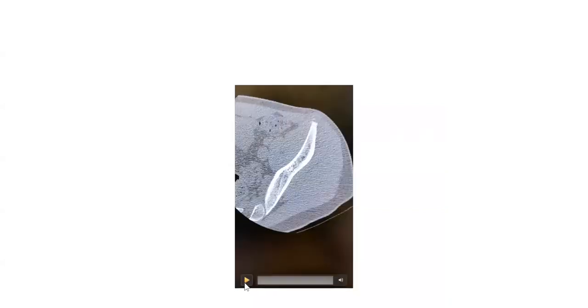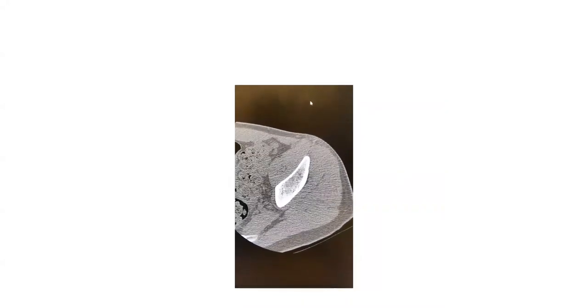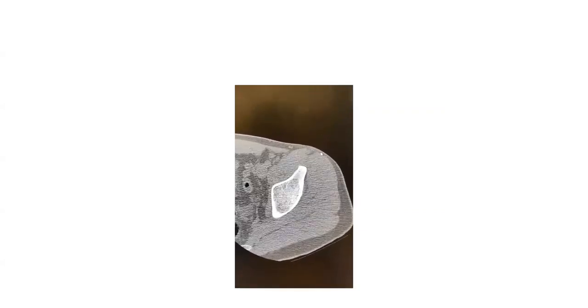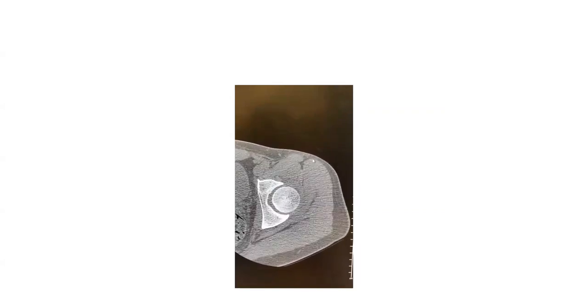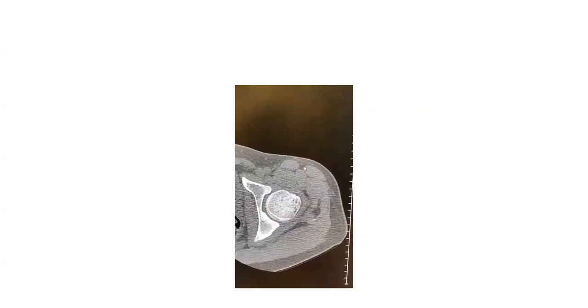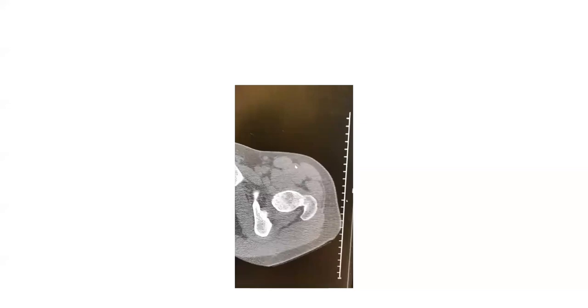So this is an example of a CAT scan, just kind of scrolling through slices. I like hips, so this is a hip. And I'm just kind of scrolling through this on my screen as I'm recording so you can see it. And as I get to this level, I can start to see the femoral head coming in, and I can look for irregularities. I can look to see if the hip is aiming backwards or forwards. So we're getting multi-axial imaging. I can image them in the axial plane, in the coronal plane, and in the sagittal plane.